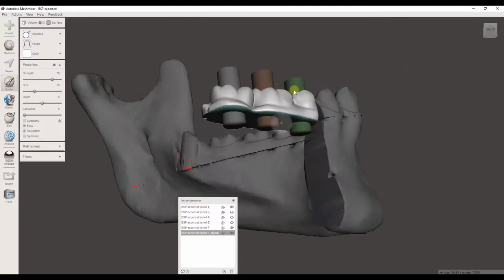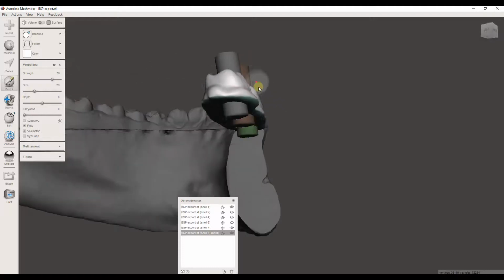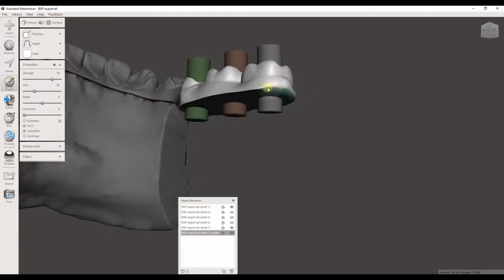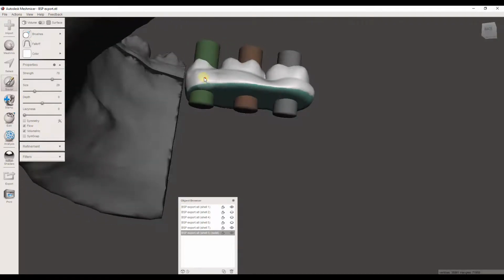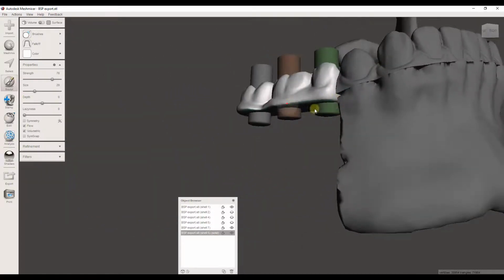And when you use this shrink smooth tool, there's a slight element of diminishing returns, where if you keep just holding it down, it's not as strong. And I think it has to do with you're making more and more tiny triangles, and so it's harder for the computer to shrink those further.